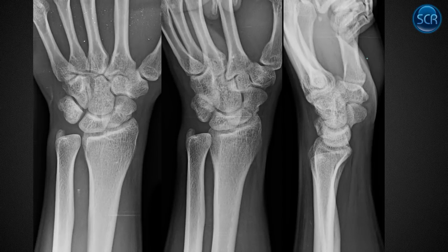All right, so in this case, this is a typical example of a scaphoid fracture. So in your proximal carpal row, you do have 4 carpals, but you don't really see the pisiform, so you can just narrow it to 3: triquetrum, lunate, and scaphoid. Okay, scaphoid looks pretty normal in this frontal projection, but on the oblique here, we have an extra line here, and so you could mistake that for a joint if you weren't being careful. So this whole thing is our scaphoid, and this is a fracture through the scaphoid.